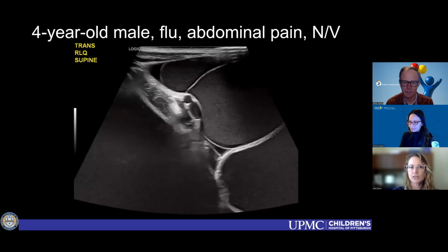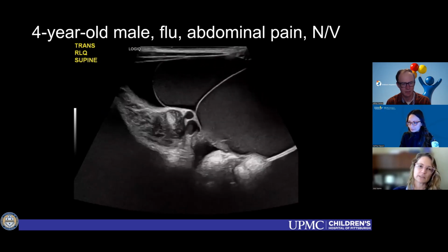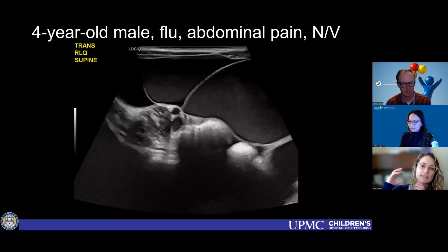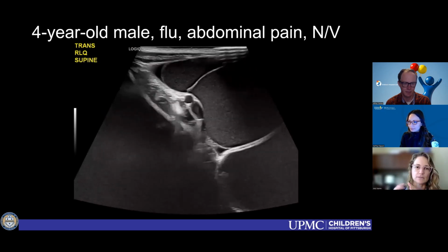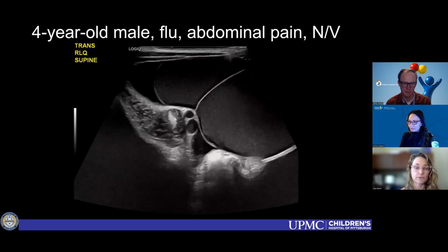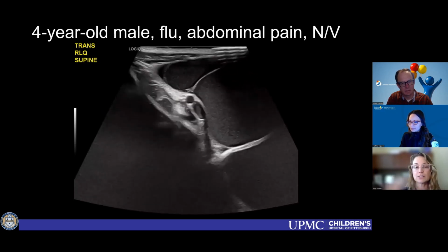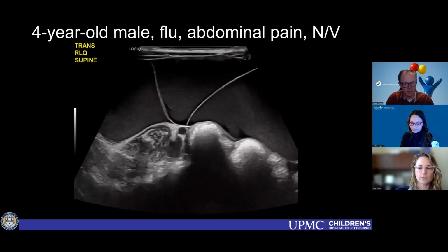I appreciate that I'm not showing you all of the cine clips of the abdomen, but I assure you this is not colon. It looks like these large locules of fluid containing low-level echoes. They were definitely mobile. And then there was a little bit of anechoic free fluid adjacent to these large globules of fluid.